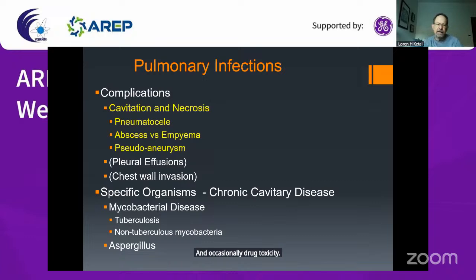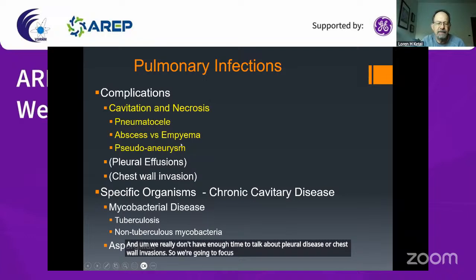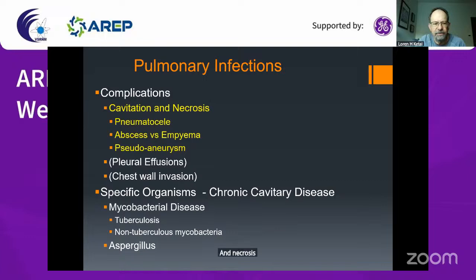Okay, we're going to move on to talk about complications of pneumonia, and we really don't have enough time to talk about pleural disease or chest wall invasion, so we're going to focus instead on cavitation and necrosis and those manifestations.